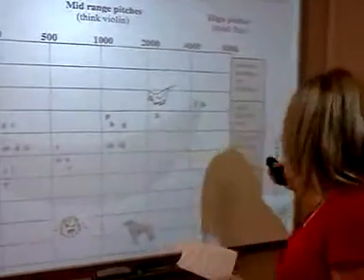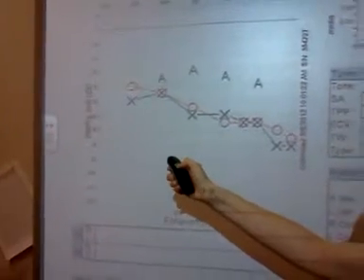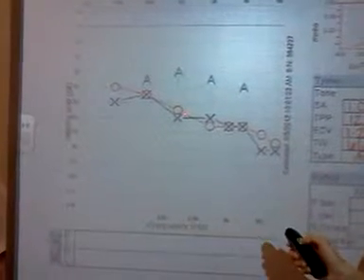Okay? Next, on the bottom right side of the audiogram is what is called a key. And this key is used to help us show what the symbols on the audiogram mean. So for example, for the right ear we have an O, and it is the symbol that is used to show the softest sounds that a person can hear with his or her right ear. And it's marked on the audiogram right here. See, the red circles are the right ear.